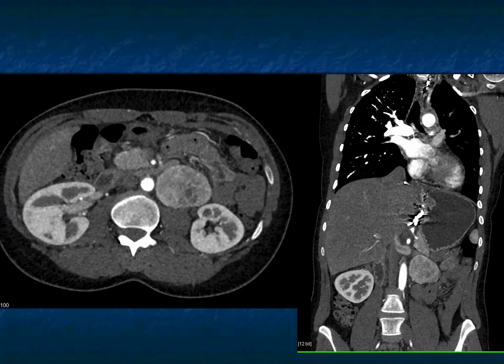But what gives you vascular masses, but it's not the adrenal? So vascular masses in general, I tend to think about neuroendocrine tumors. We think about pancreas lesions like islet cell tumors. We talk about some neuroendocrine tumors of the small bowel and mesentery, but this is in the paraaortic region. The thing you need to think about, everybody together, paragangliomas.